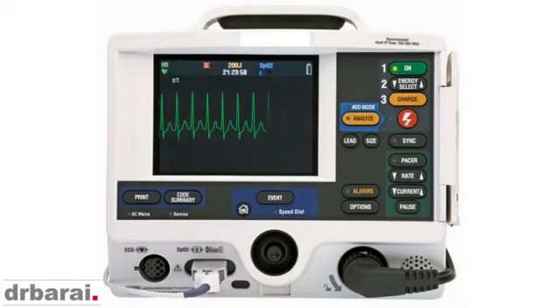Now, this is a young patient, 26 years old, who came with palpitations. Hemodynamics are stable, and when we connected the defibrillator pads, this is what we found. First of all, this is a narrow complex tachycardia. The QRS complexes are pretty regular and fast, and I cannot see any obvious P wave. This is called so-called supraventricular tachycardia or SVT.